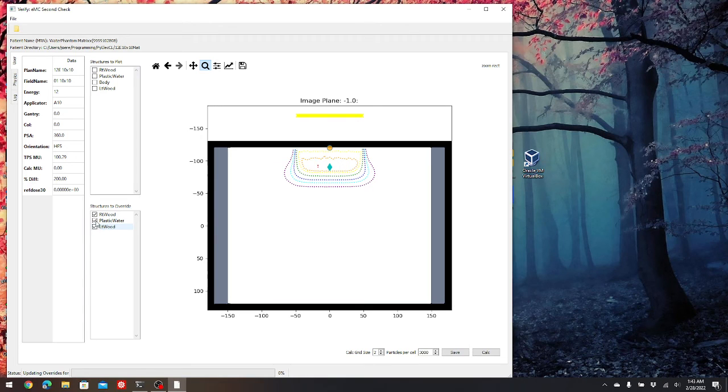You can also take these off again if you want. It takes a minute to run, but it's not instantaneous by any means, so just be aware of that. And you might get the hang up and it'll say not responding at the top window. It is doing something. Like I said, there's just no async await kind of logic in here yet.